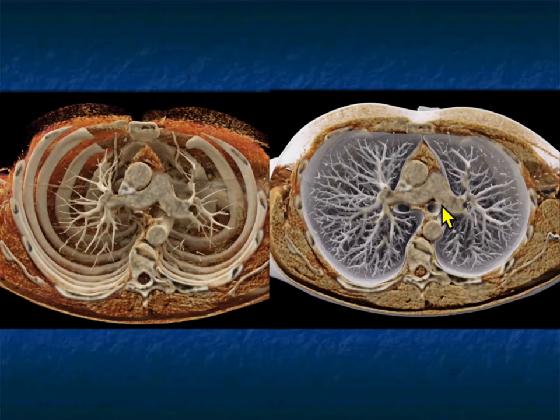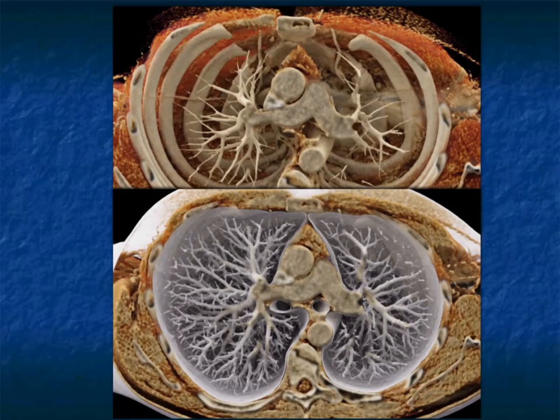Here's the thymus gland, nicely shown here. Again, right between the two lungs, sitting perfectly. Anterior mediastinum, triangular shaped, fatty infiltration. What do I do with this?